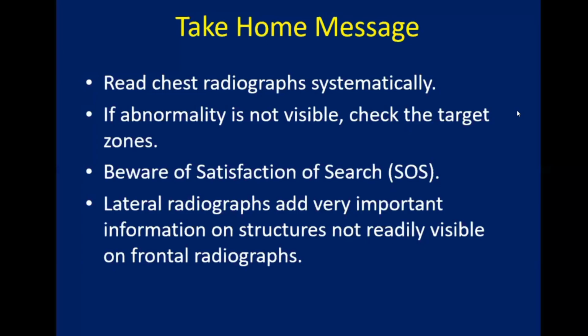So your take-home message here is that you have to read the chest radiographs systematically. For me, this is the approach that I follow. I don't mind if you follow any approach that you may like. However, be always consistent and systematic in reading the X-rays. This will ensure that you will not miss a major finding.